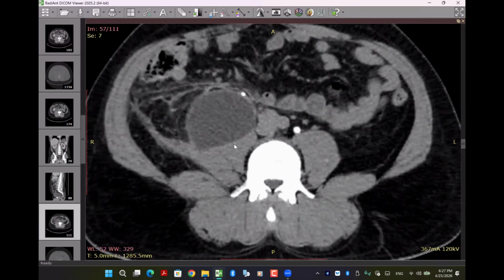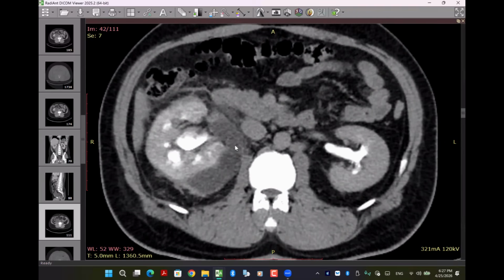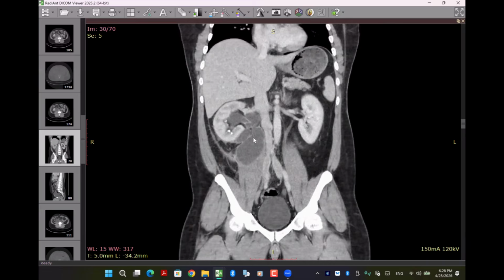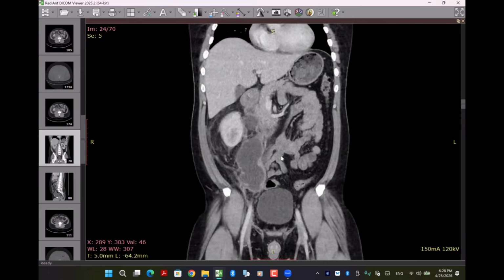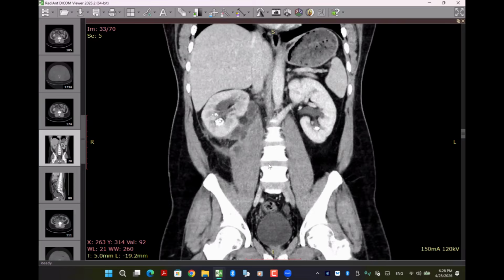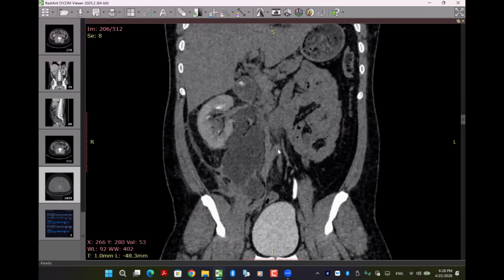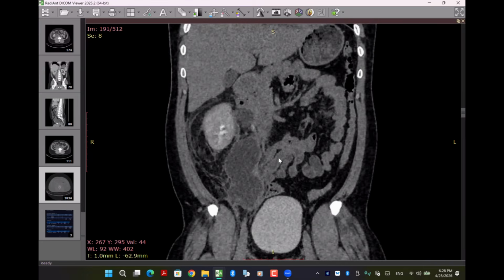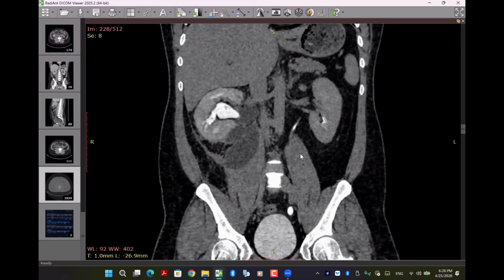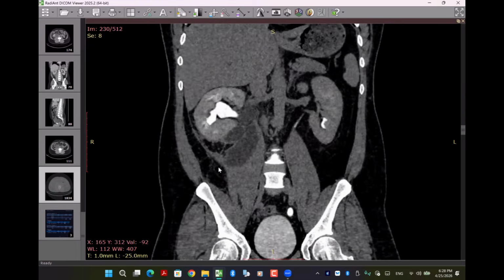So what can you give me in your diagnosis for this one? You're doing good. What can you give me in your diagnosis and what do you want to ask about in this case? I give you the coronal to check the extent. This is an extensive disease process involving the right kidney with internal fat and obstruction. The first differential I was thinking about was xanthogranulomatous pyelonephritis; another differential is calyceal rupture due to obstruction leading to urinoma formation.